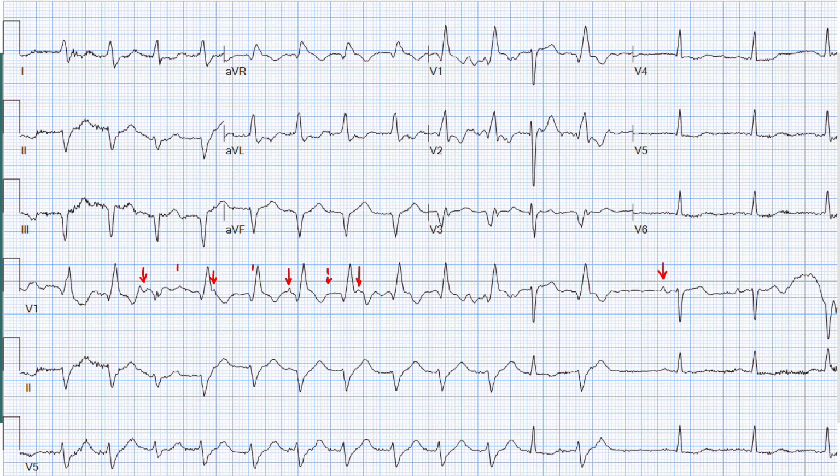So there is certainly an atrial rate overlying this wide complex tachycardia, and the ventricular rate is much faster than the atrial rate. So this rhythm is driven by the ventricles. This is going to be VT almost certainly. At this point I would just stop and call it VT, but if you wanted to use other tools, we can certainly do that.